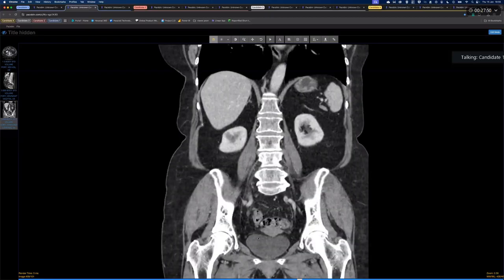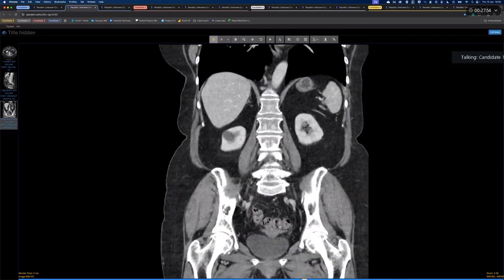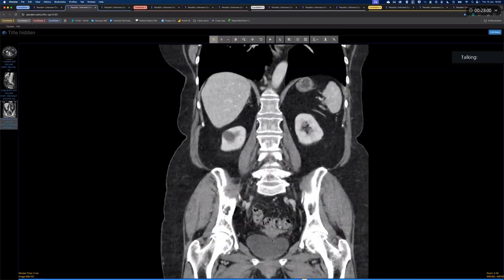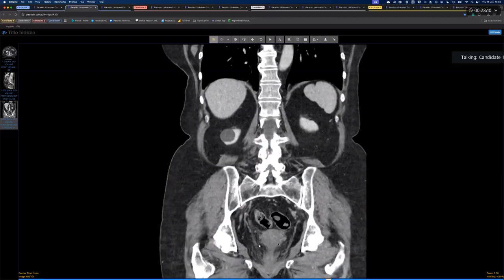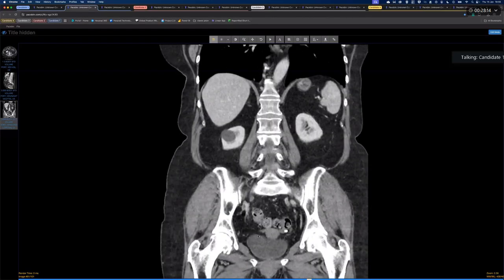So I would like to correlate with the patient's history, if she's having any infertility or any previous history of pelvic inflammatory disease that might cause this tube to block, distend and fill with fluid, and would like to correlate with any other previous ultrasound images if available.